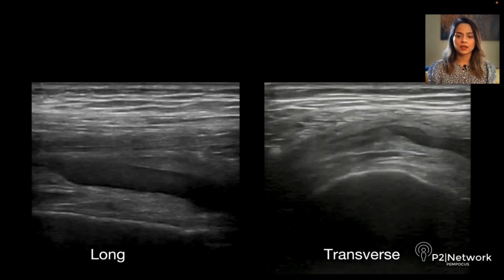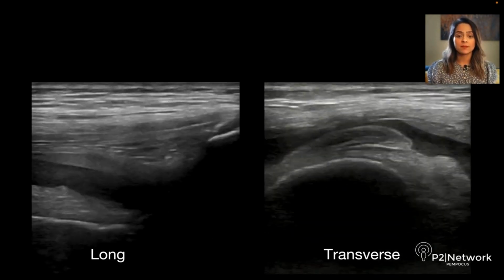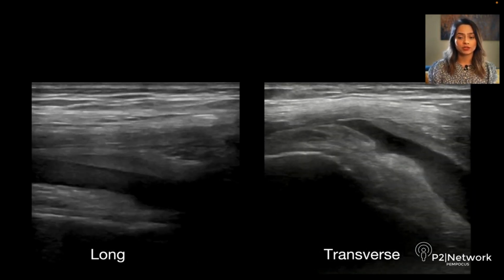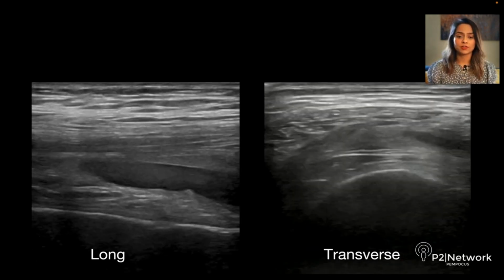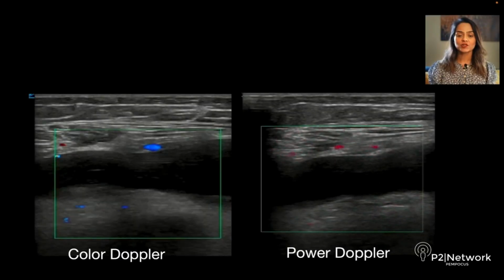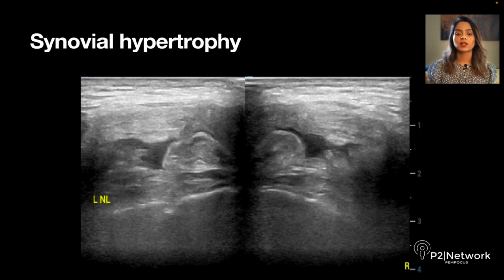Heterogeneous effusions contain echogenic particles or fronds in anechoic fluid, which may represent escaped blood and fat from bone marrow in the joint due to trauma, called lipohemarthrosis, or they could be infectious or inflammatory particles. Effusions show displacement of fluid when compressed and do not exhibit signal on color Doppler. This is in contrast to synovial hypertrophy or synovitis, which is defined as an abnormal hypoechoic intra-articular tissue that is non-displaceable, poorly compressible, and may exhibit Doppler signal.